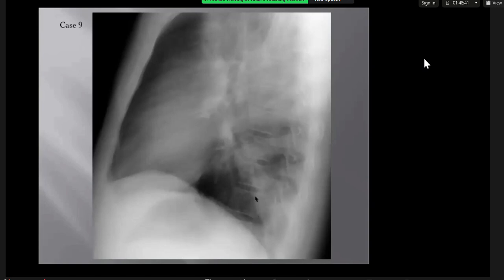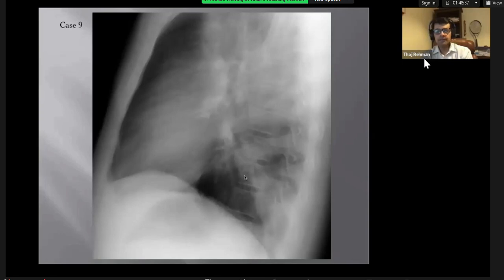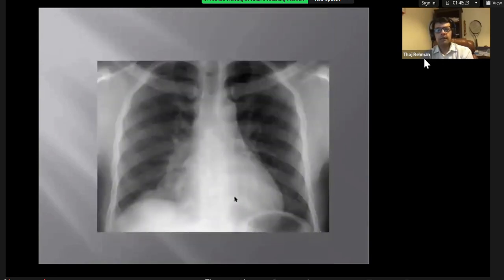So in my normal practice, I check the frontal chest X-ray first. Yeah, very good. Just check this frontal first, and you can see that there is an opacity projected over the spine, just in the lung, and then distally there is further opacity, so probably a mass with distal consolidation. But check the X-ray first. This is the frontal. Does that help?